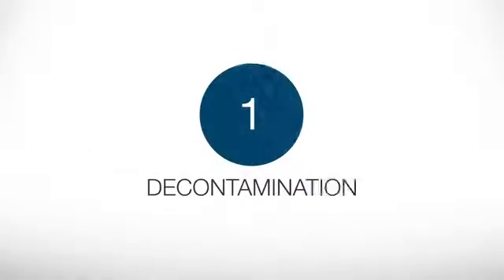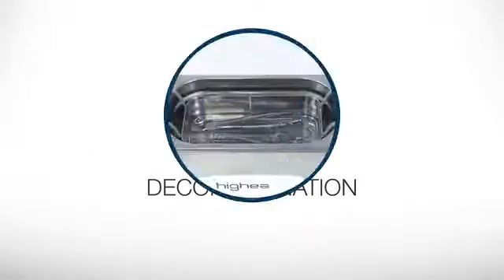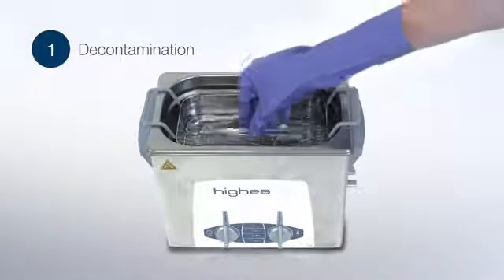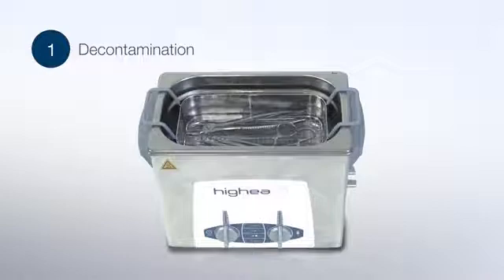The first step of the process precedes washing and disinfection of the material. It reduces the amount of residue present on the instruments and allows staff to group material to be dealt with.